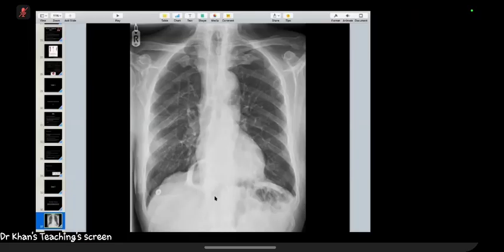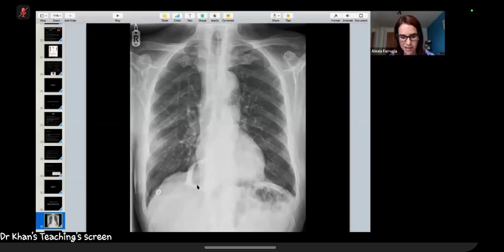I think, yes, it's coming in and out. I can see that there's a linear structure sort of in that gastric bubble. Okay. And then going down to there, I can't really see it beyond there. Okay. So I presume it is appropriately placed.